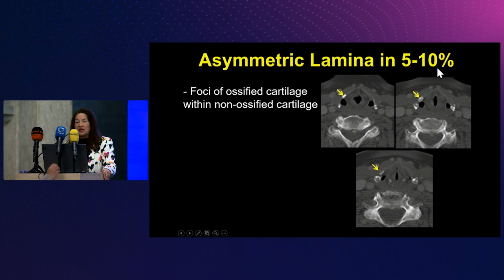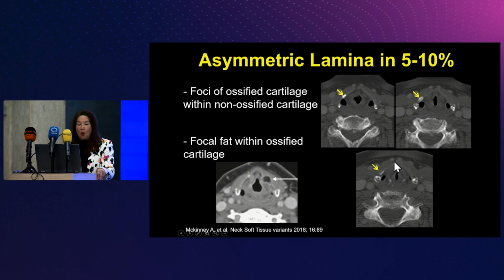In the 5 to 10% of patients that don't have symmetric cartilages, you'll frequently see foci of mineralization within non-ossified cartilage, as you do in these patients. Here's another patient.